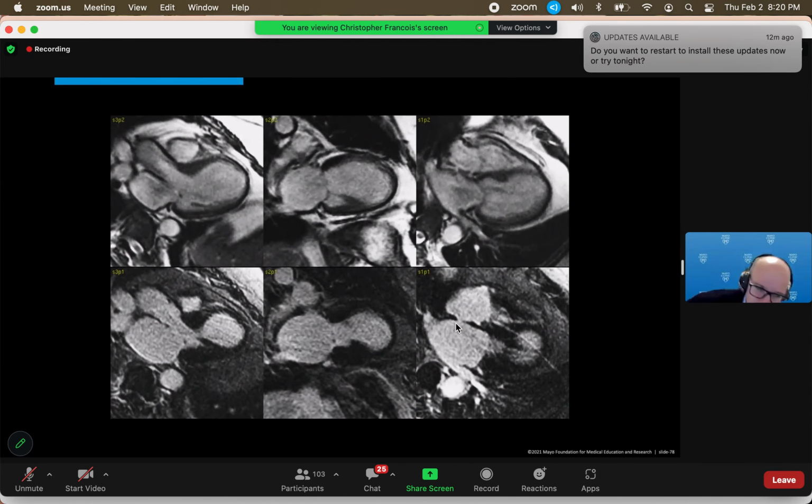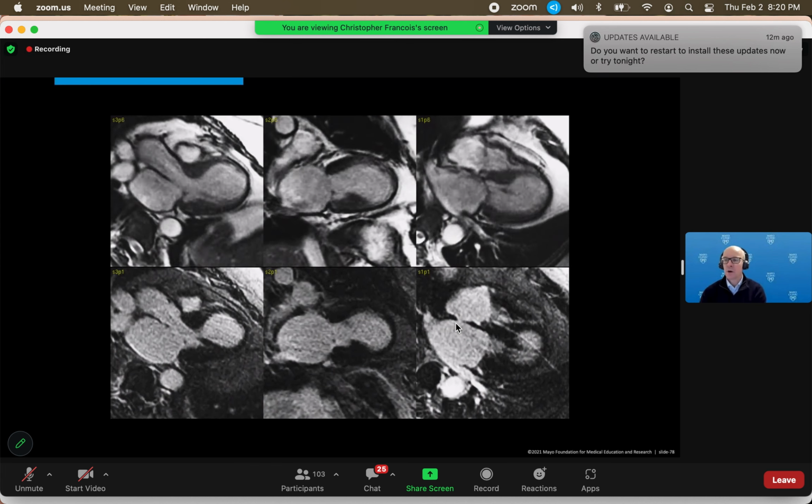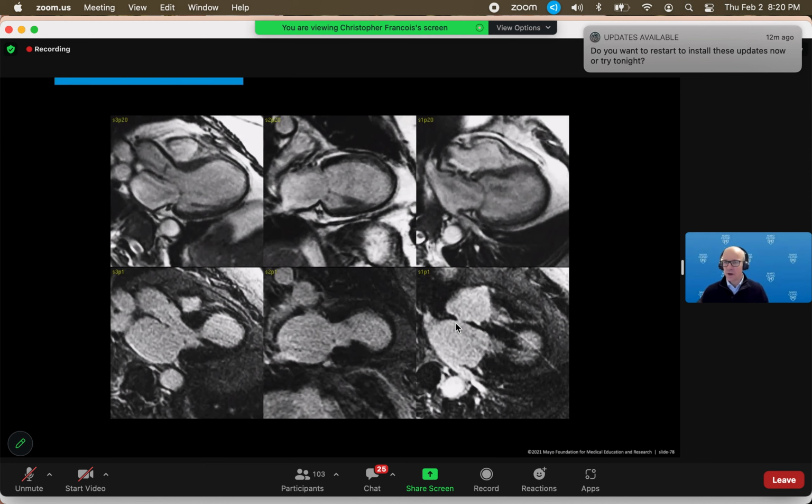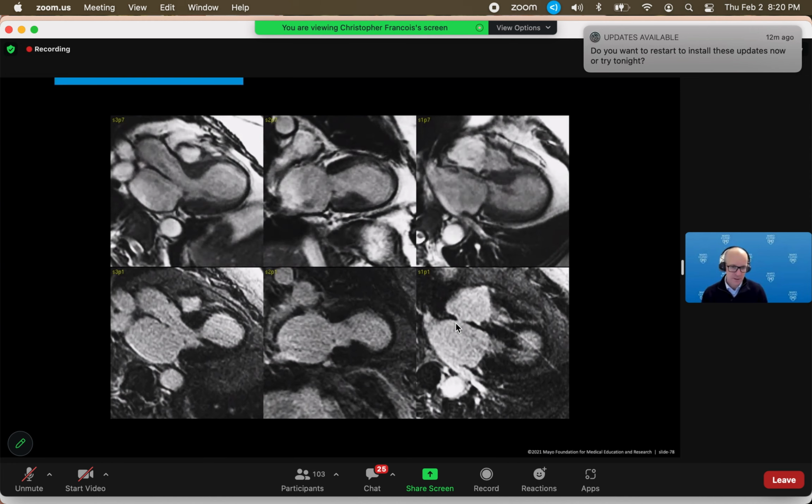This is another patient who presented with acute chest pain. Additional relevant clinical information in this case: this is an 85-year-old woman, and 2 weeks ago her husband passed away, and so this is stress-induced cardiomyopathy, left ventricular apical ballooning, or Takotsubo. They're all synonyms of each other.